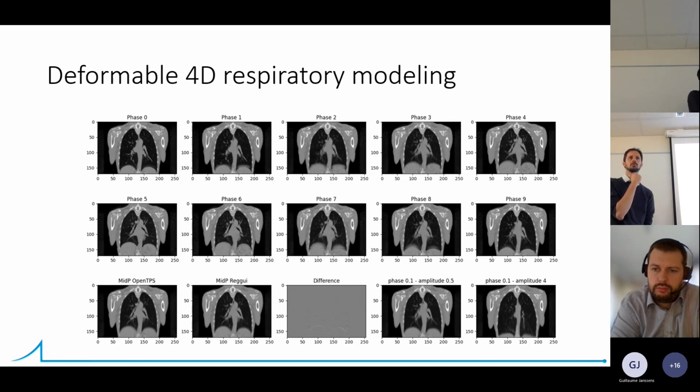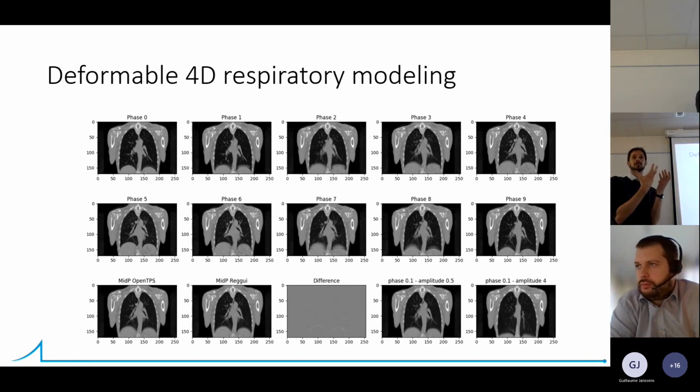The 3D model, where do you put it? So it's in the patient list. So I would say inside OpenTPS, it's the binary format of OpenTPS. So you can look in the structure of the object that is described in the Python code. But there is no export into files at the moment.